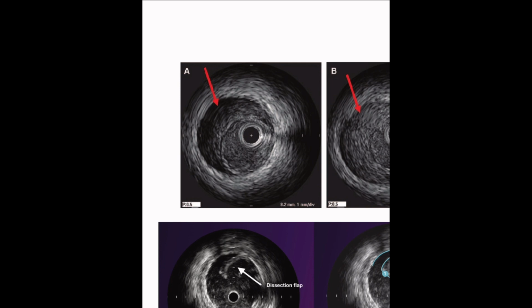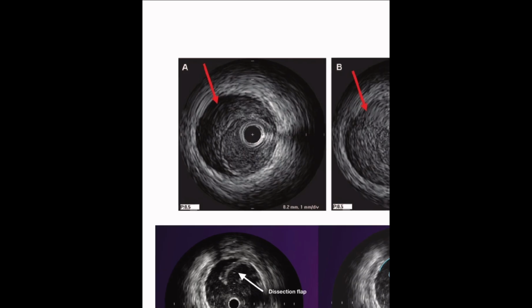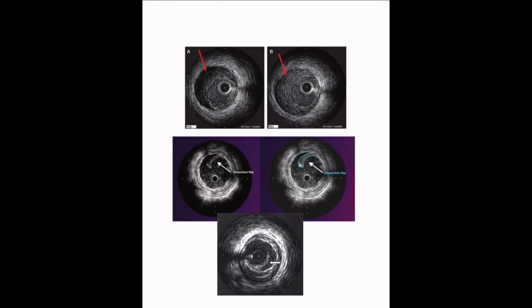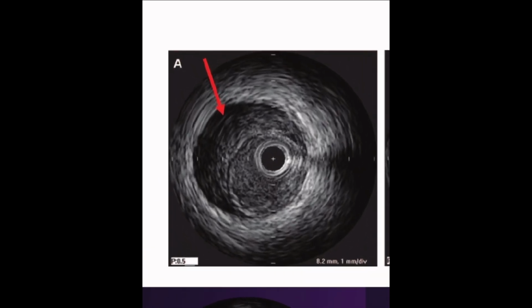Instead, mostly what you're going to be using it for is dissection, stent edge dissection, and then dissections can progress into intramural hematomas, which is essentially bleeding right within the vessel walls, but it's not a perforation because it's not exiting the vessel walls. So it's contained, still at risk of perforation and other things, but you can identify it with intravascular imaging. So I chose the clearest examples.